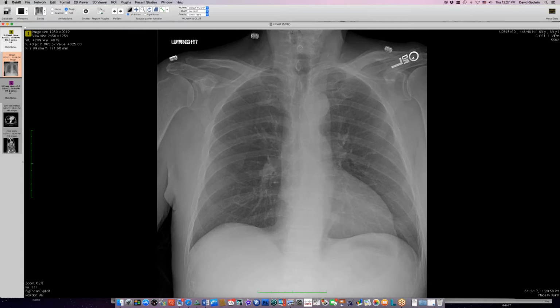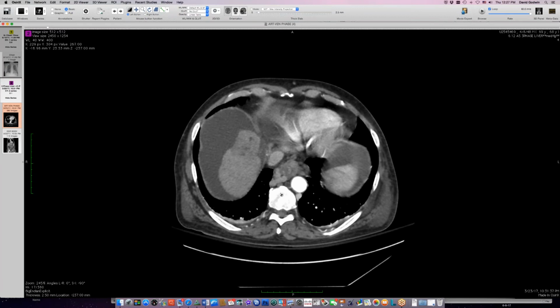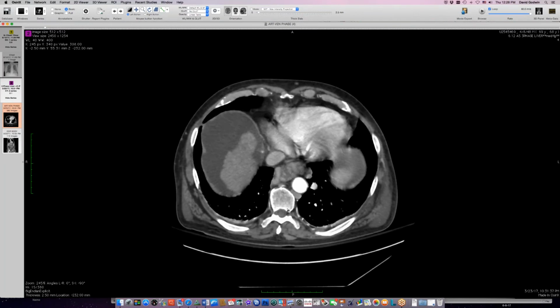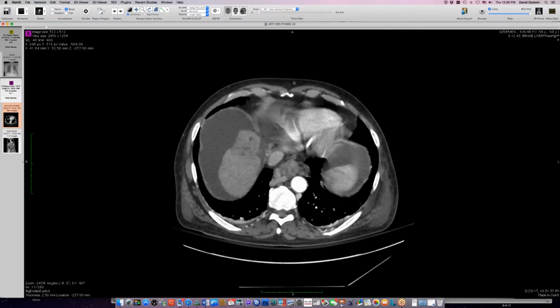Okay. Wow. So this next case is a guy with hepatocellular carcinoma from HCV infection, and his radiograph shows a nodule here that looks like a metastasis sitting in the left lower lobe. He got the CT scan, which shows the genesis of this nodule. First of all, he's got cirrhosis and ascites, and a mass of varices here in his mediastinum. If we follow these varices up here, we see that they flow into this lung lesion down here, and this lung lesion is an extension of varix into the lung.